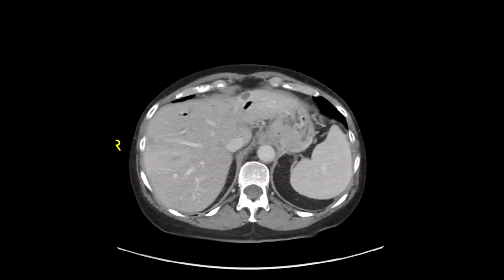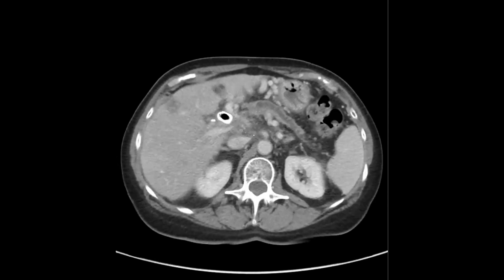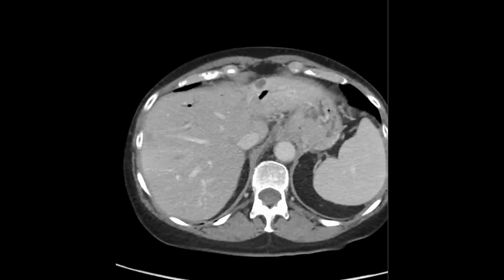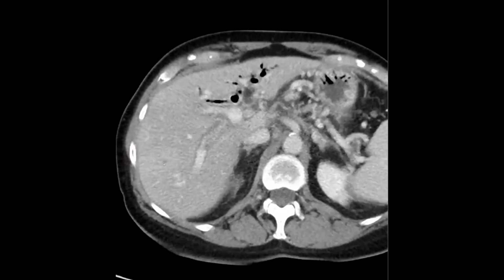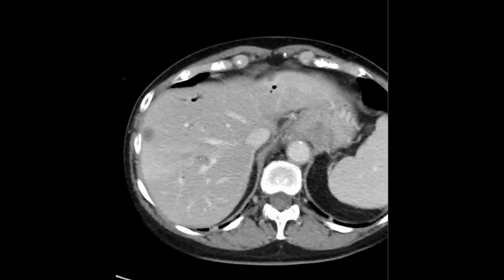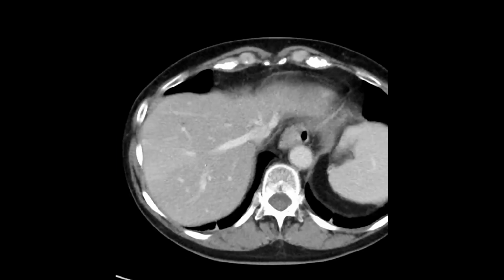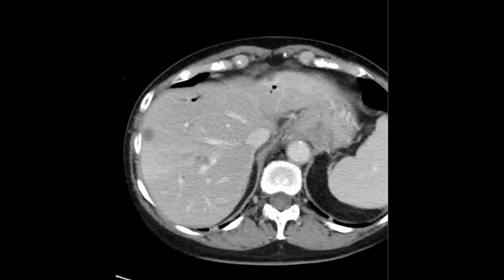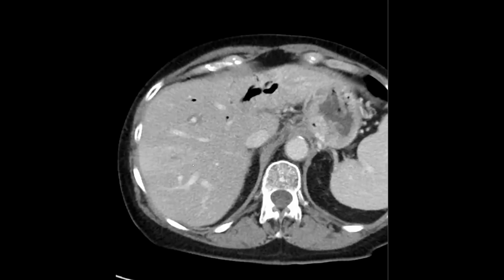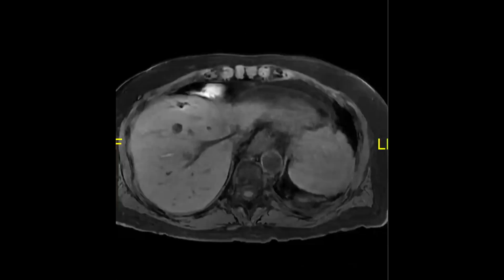So this patient had multiple metastases, I think from pancreatic cancer. At the time on CT, this was noted. They said, okay, we see a thrombus, and maybe they weren't sure if it's tumor thrombus because it's sitting right next to the central metastasis. So they said, maybe get an MR for a better look. And so here's the MR.